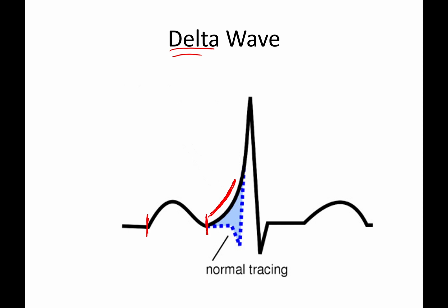And in this scenario, that is going to be my PRI, because starting here is where my QRS goes up and down and back over to here. And so from here to here is my QRS.